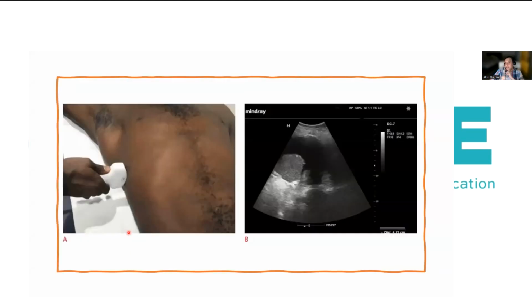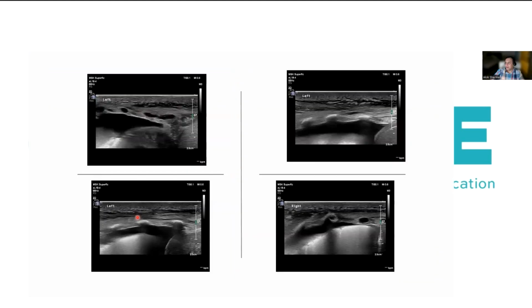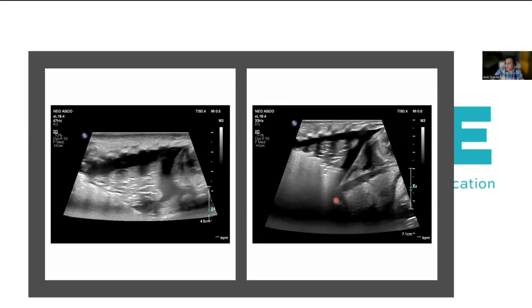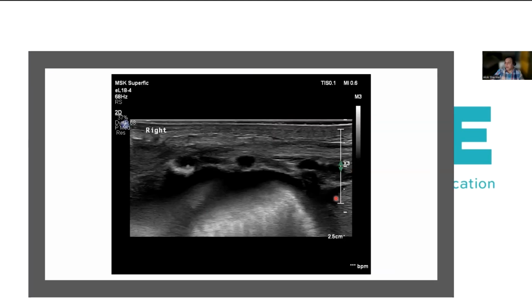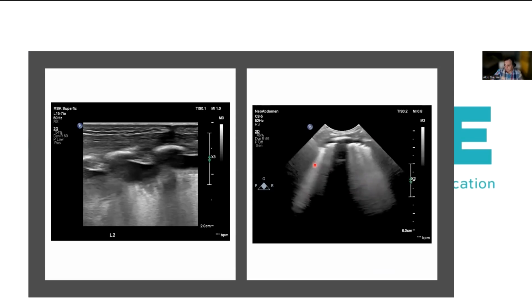There are no studies, to the best of my knowledge, that replicate this process in neonates, but I would say the formula, with some element of plausibility, can be used. I think what I'd say is fairly obvious: quantifying a large pleural effusion is not difficult. You need to clinically correlate as well. And as all these images show, you can quantify a large from a small pleural effusion quite easily.